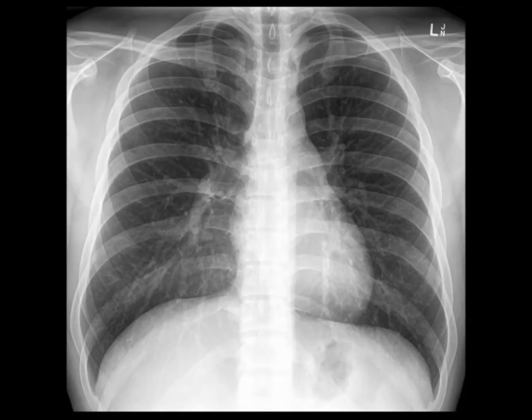Next, we're going to work through the anatomy that can be seen on a normal chest film. As you can see, there's a letter L in the top corner telling you which side is left. First of all, let's look at the airways. You can see the borders of the trachea as it runs down the centre. Next, we will look at the bones. The bone I have outlined here is the left first rib, running from posterior at the top to anterior at the bottom. The first rib isn't always visible on a chest film, but if it is, you can use it to count all the way down.